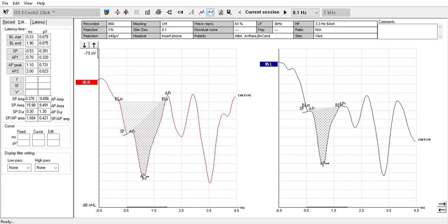And so this is more concerning than the other just because it's higher, but a lot of research shows that we're looking anywhere between 0.4 to 0.5. We want it to be less than those values, so that rules out the possibility of Meniere's. I say this with caution because if a patient is not actively having a Meniere's attack, then this still might be normal. So this is a test that's helpful, but also has some limitations as well.